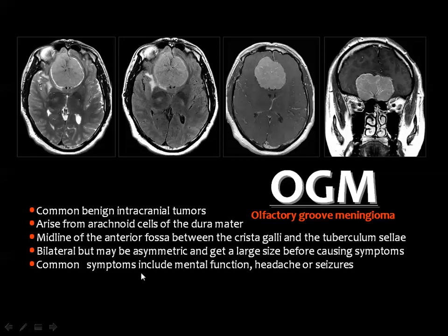And it's commonly a homogeneously enhanced lesion of intermediate signal in the T1 and T2 weighted images. And sometimes you can see the CSF cleft sign, which is an indication of an extra-axial lesion. And I have explained this many times in the lecture of brain tumors.